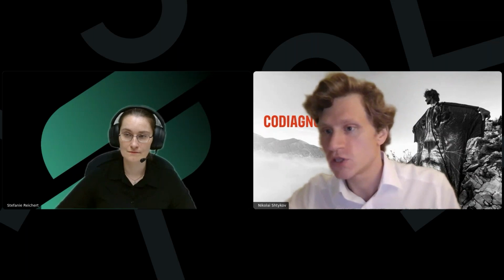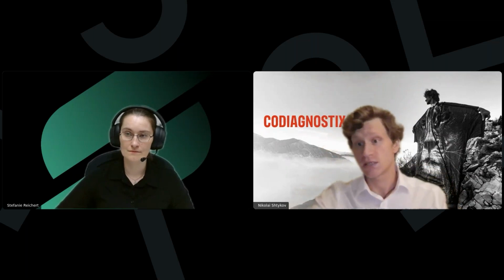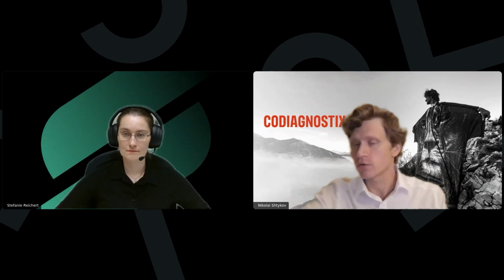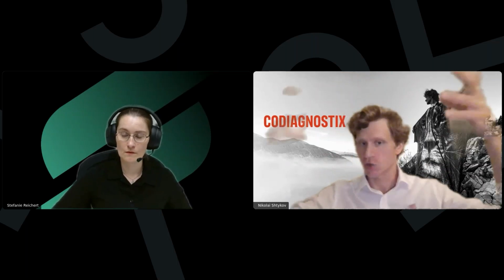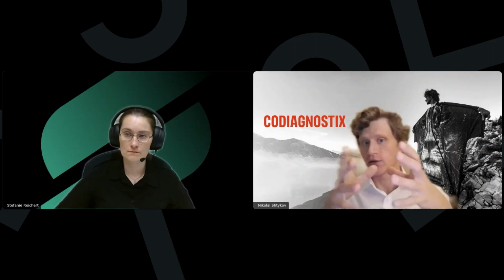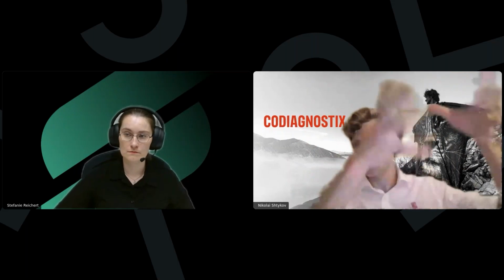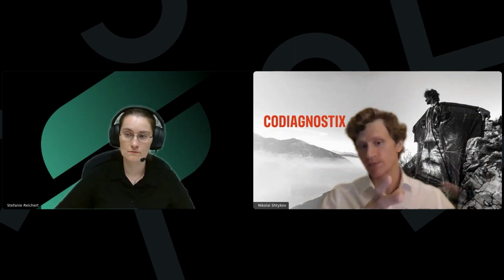To put the titanium cylinders over the SRA. Yes, that's what I'm talking about. Or do you mean which titanium cylinders? Because I created this cylinder, this is like a continuation of the SRA. There will be our coping, and you have space there.